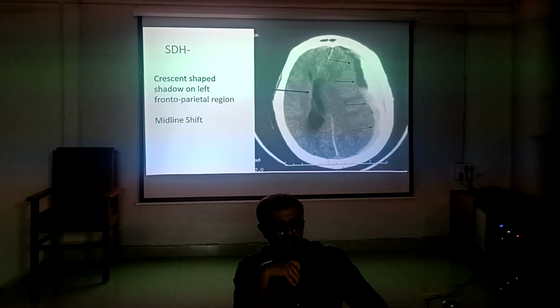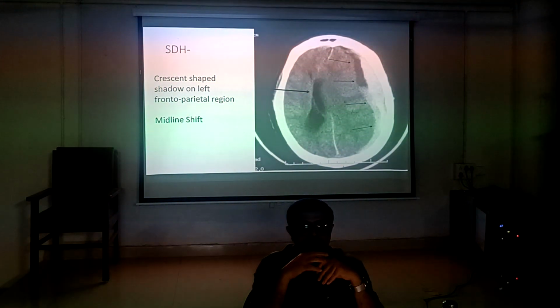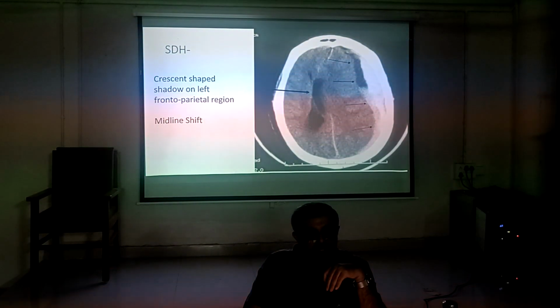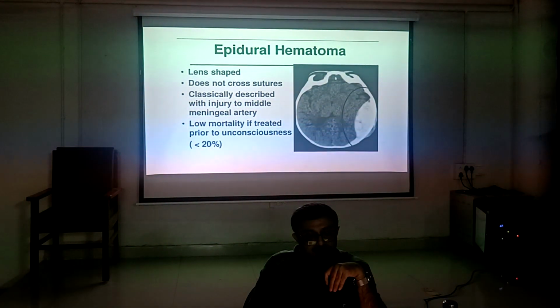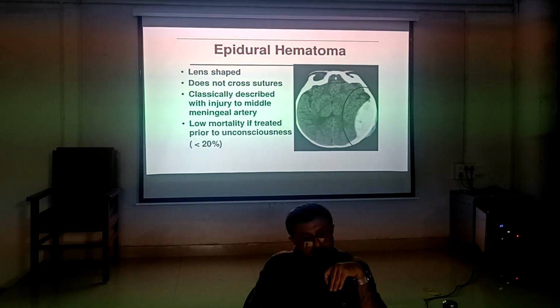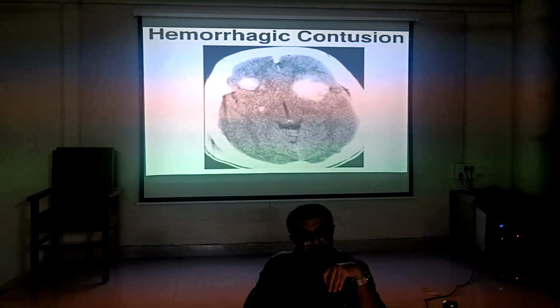And yes, you can see here the ventricle, a midline shift. The left ventricle is pushed to the opposite side. It is a midline shift. Midline shift is dangerous. Epidural hematoma or extradural hematoma is more dangerous than SDH.